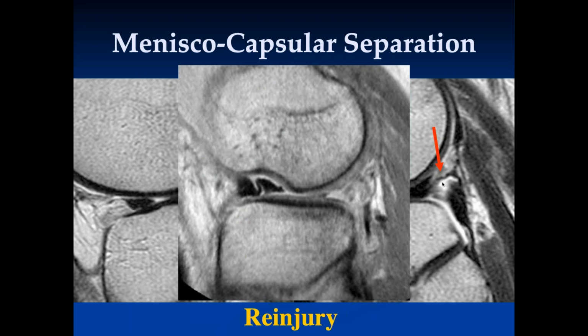So what we're seeing, and it looks like the posterior horn is displaced right posterior to the anterior horn, significantly displaced. So the patient on the second injury actually got an ACL tear. This is a typical pivot shift impaction injury on the lateral femoral condyle here. And these damaged capsular ligaments here completely tore, allowing the posterior horn to flip anteriorly against the anterior horn. This patient came in with locking of the knee.